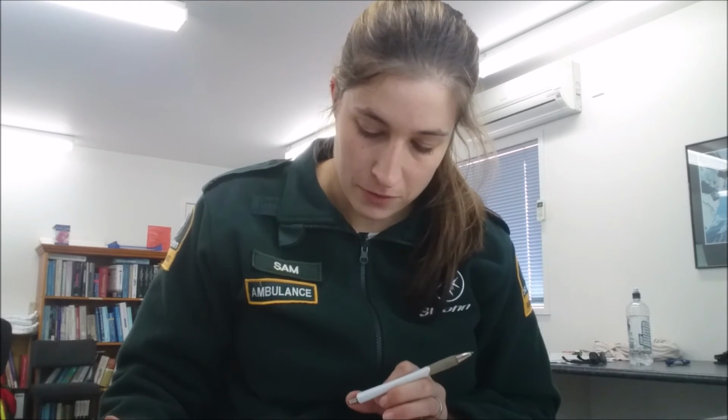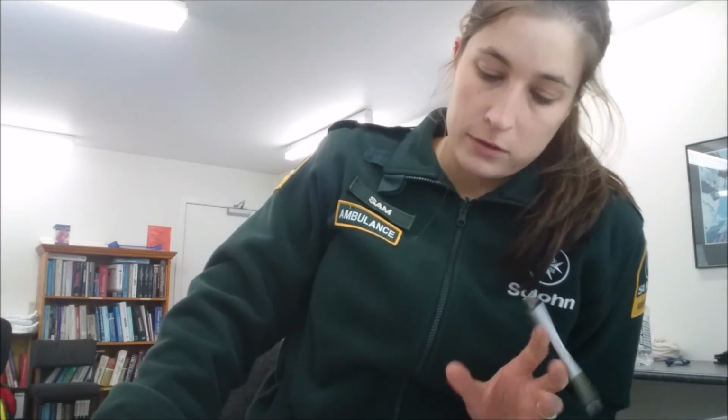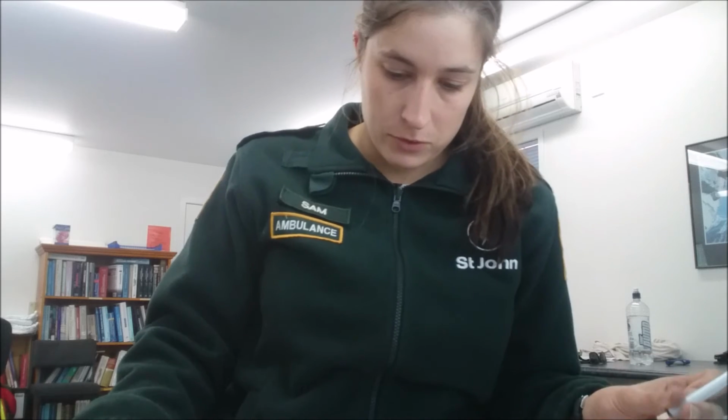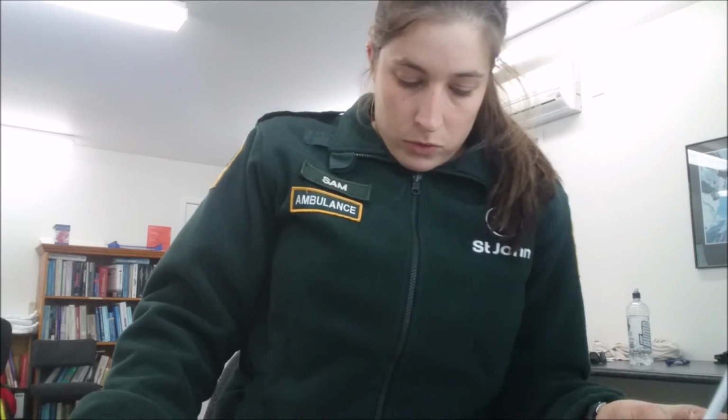Okay, start again, just do that whole interpretation again. So I've got sinus tachycardia with a septal anterior STEMI. Also have some lateral involvement, and we've got left ventricular hypertrophy.